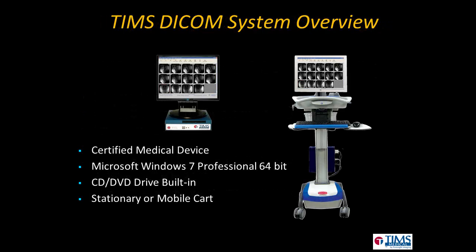Because TIMS is a certified medical device, it can be used pretty much anywhere in the hospital, and your IT department will appreciate that it's already running Windows 7 Professional. And although we're typically helping hospitals migrate away from DVD, the built-in DVD drive does allow you to burn a copy of a study for an outpatient that needs to bring it back with them to the referring physician or therapist. TIMS is available either in a stationary configuration or on a mobile cart. The mobile cart allows it to be wheeled up right next to you during the procedure so that you can interact with it during the study if you'd like to.